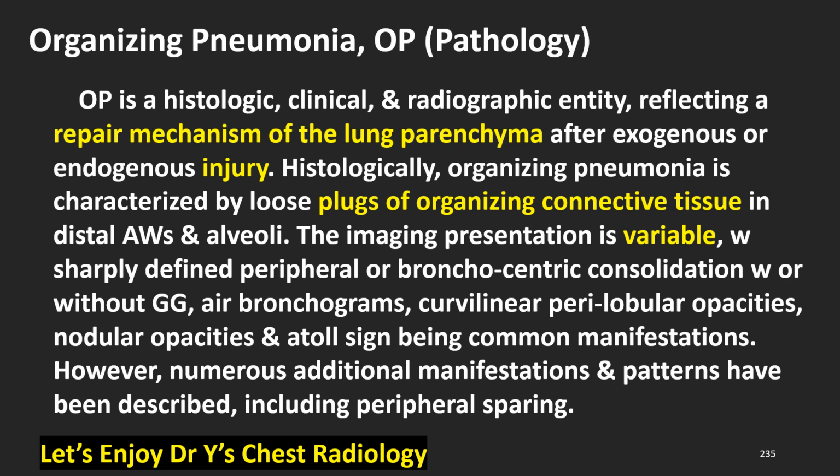The imaging presentation is variable, with sharply defined peripheral or bronchocentric consolidation with or without ground glass, air bronchograms, curvilinear perilobular opacities, nodular opacities, and atoll sign being common manifestations. However, numerous additional manifestations and patterns have been described, including peripheral sparing.